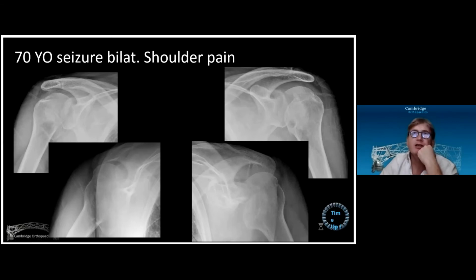Okay, my interpretation of the x-rays on the right: I see a humeral head, but not all of the humeral head. And I see the continuation there. So this is the head split, the one that was defined by Neer as the impaction fractures. He was talking about these posterior fracture dislocations.